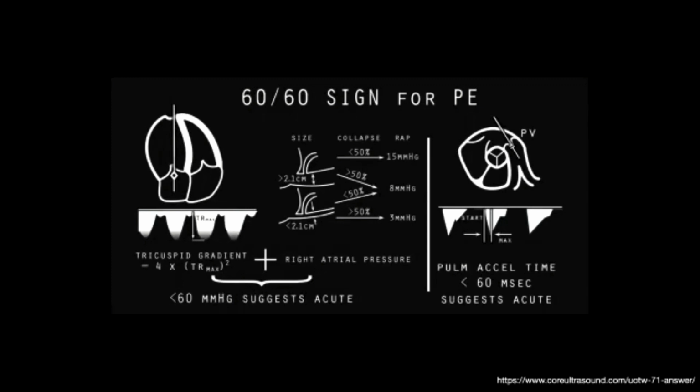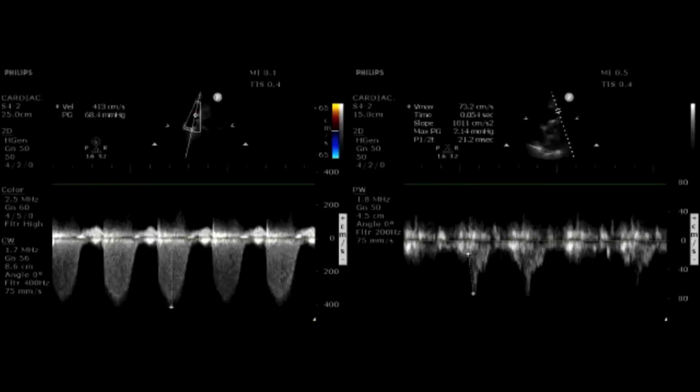No, great. Thank you, Ashish. I think that's super helpful in understanding it. And so just to recap, we have these two things, right? We have the pulmonary artery acceleration time that we measured in the pulmonary outflow tract, and we can see that on the right-hand side in this in vivo image. And then you have that tricuspid regurg jet that's going to be a reflection of the pressure being seen in the RV, in the pulmonary artery that we're measuring here.